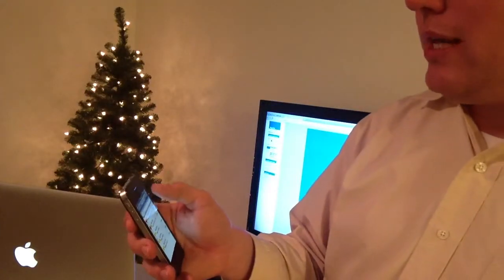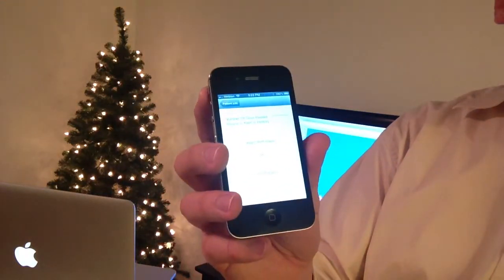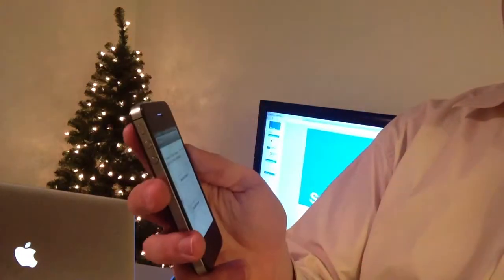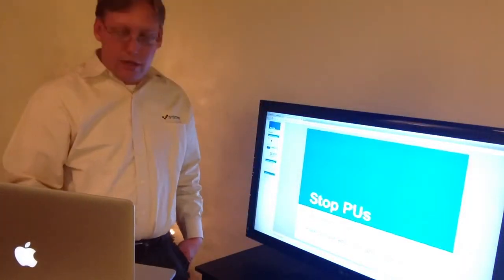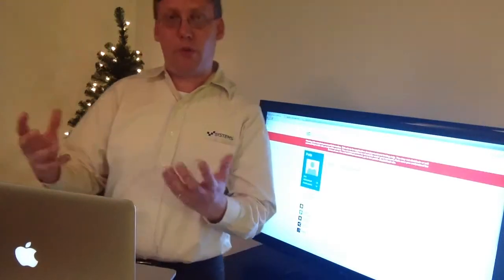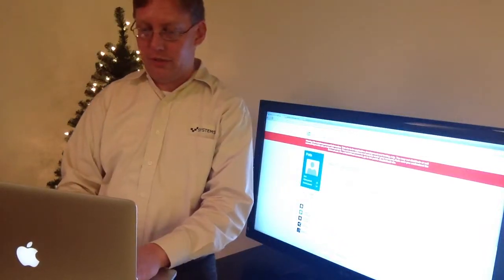And then when the shift is over, you come back in to the application, you end your shift export, and at that point you are sending all of the data, all the images of the pressure ulcers, the risk assessments, skin assessments with the wounds. You are sending that up to the custom application that integrates with Microsoft HealthVault, and all the patient information is then gone from your phone. So at that point, you then go over to Microsoft HealthVault, which was bound to that patient, and part of the information that you got for the starting of the shift was a list of the patients, including Microsoft HealthVault.